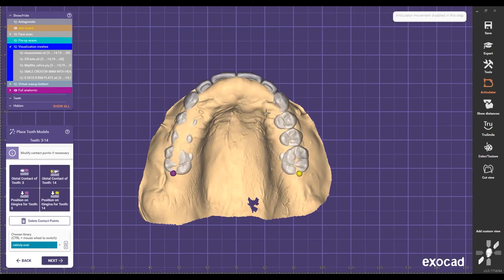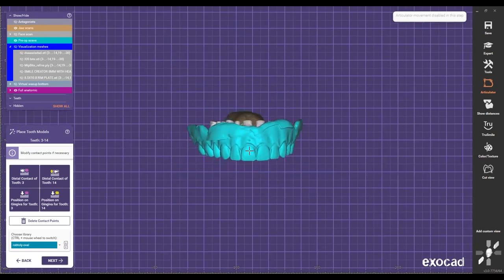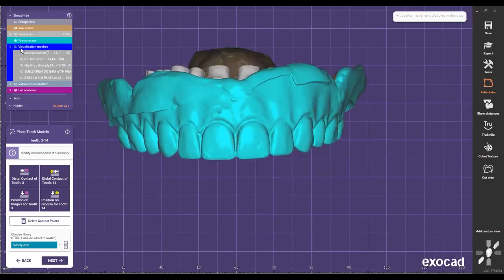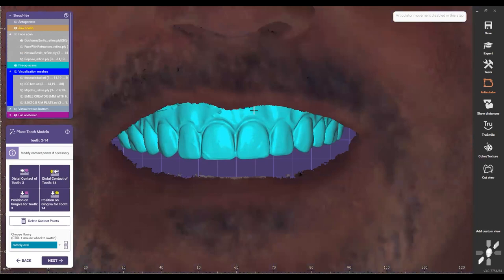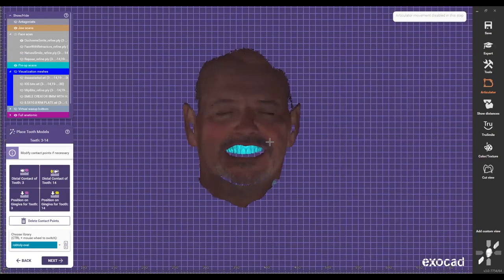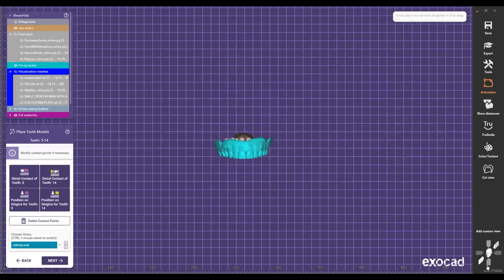So from here, right, I need to know what's gonna be the ideal size of these teeth, right? In this case, he's a big patient based on his face. I can see that he's a big male patient, probably like 5'11", 5'12". He's a big guy. So that means that I'm not gonna give him small teeth. I need to make sure that I give him at least 8.5 to 11 millimeters size.